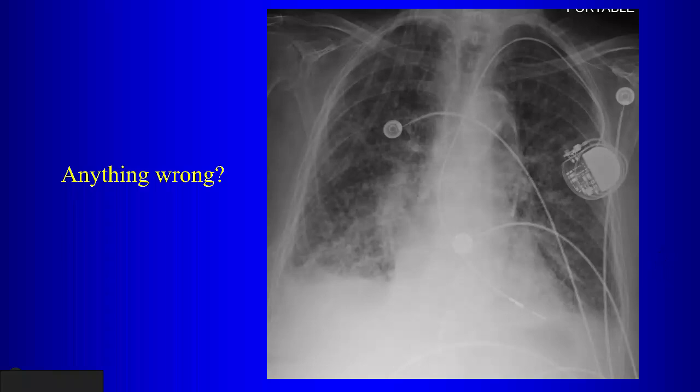Looks like it's through, probably, the artery. Okay, so the SVC, the superior vena cava, this patient's not that rotated, but the superior vena cava should be to the right of the trachea, right? And then the lead should come down from there into the right atrium. This thing is displaced too far to the left.